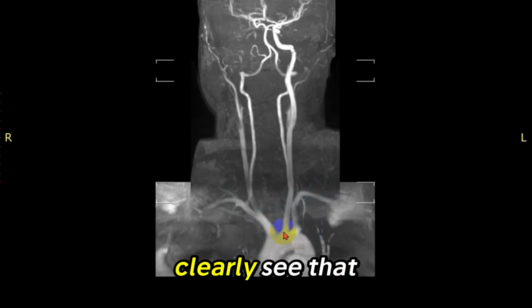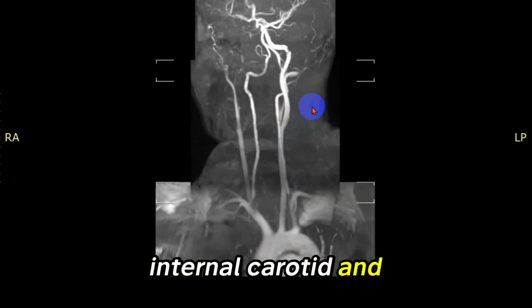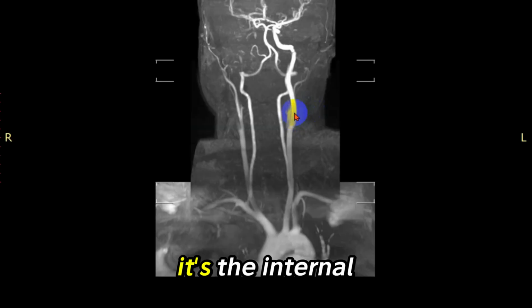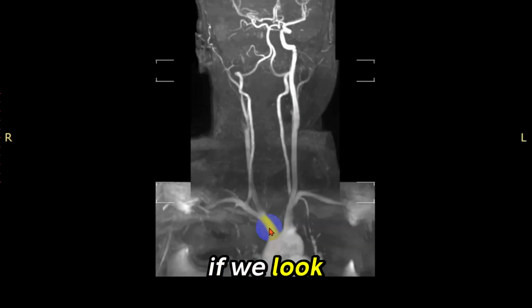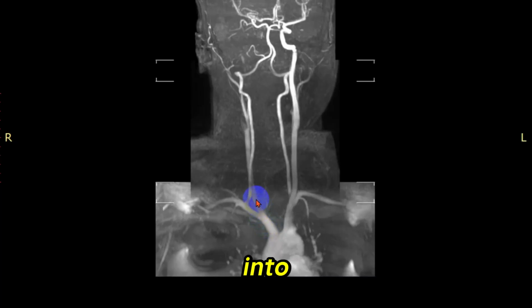Here we can clearly see that this left common carotid goes upwards, and here it divides into internal carotid and external carotid arteries. The internal carotid artery on left side is clearly visible here, but in the right side, if we look at this brachiocephalic trunk, it primarily divides into right common carotid artery here and right subclavian artery here.